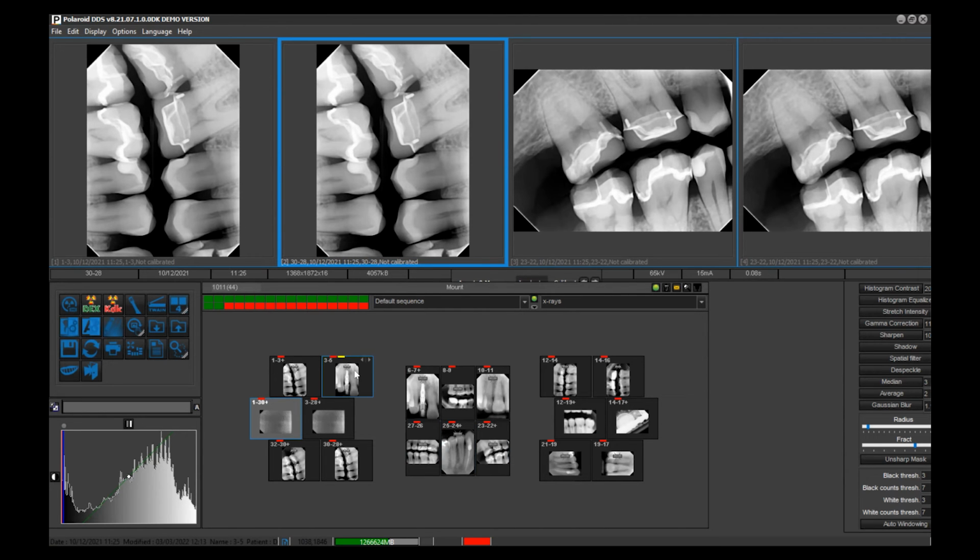If you want to see the history of an image. Okay, right. So like right here that this is highlighted. See how when I hover over it, there's little arrows. So if I press and hold, is it the right button? Yep. No.